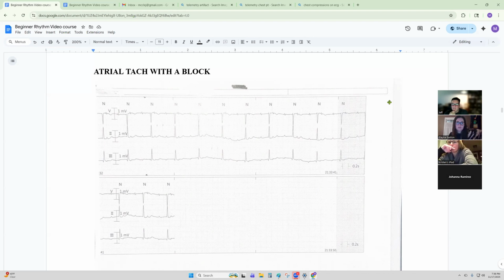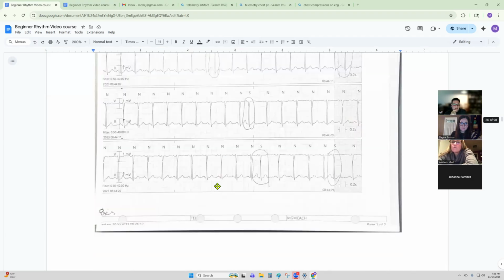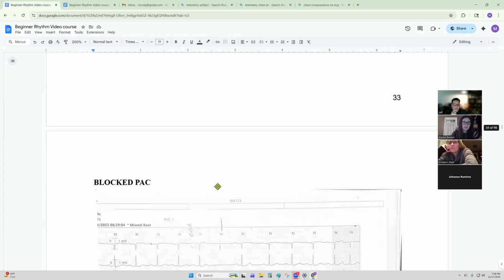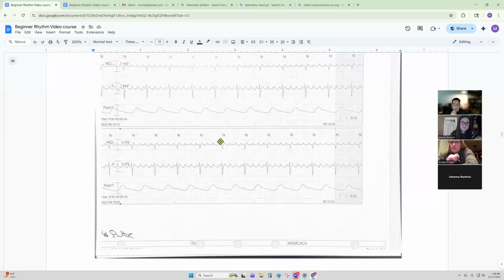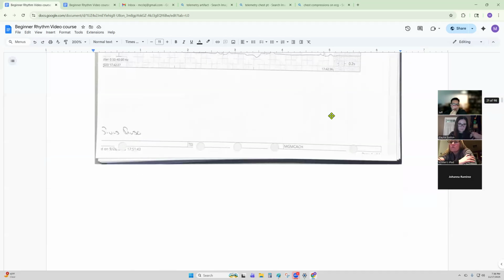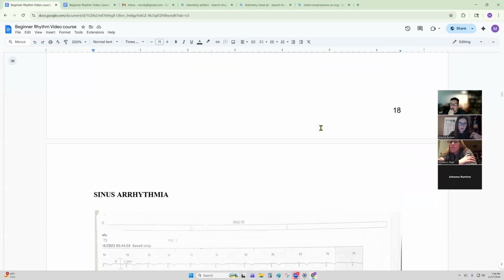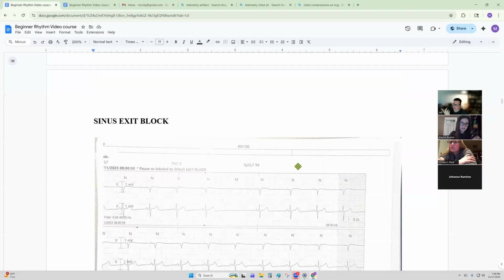And I like this example because you can see the difference between atrial tach and flutter. In flutter, that atrial activity immediately transitions into another atrial activity, right? It comes down and goes right into another one, whereas in that previous picture, you had an isoelectric baseline between the two. And then AFib is even more quivering of that baseline, not like the atrial tach.